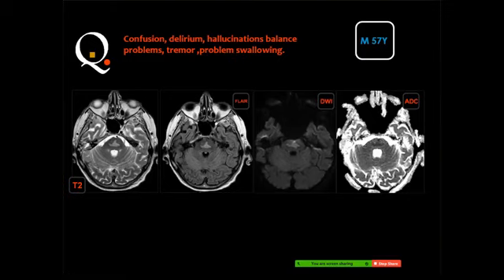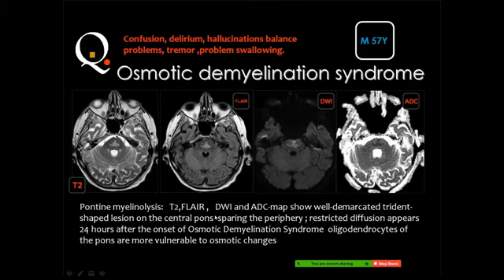Central pontine demyelination. Yes, and this is central pontine myelinolysis, and you see the Mexican cap, and also you can see some diffusion restriction. And I said in my lectures that these lesions do not show diffusion restriction, and this is good for the chronic lesions, but the acute onset lesions will show diffusion restriction, as you can see here.